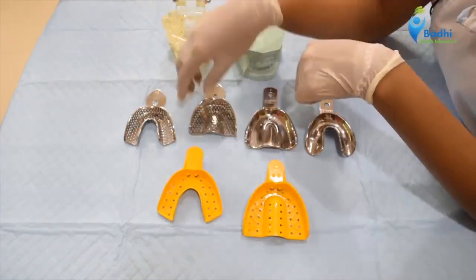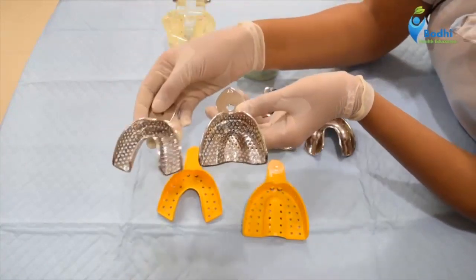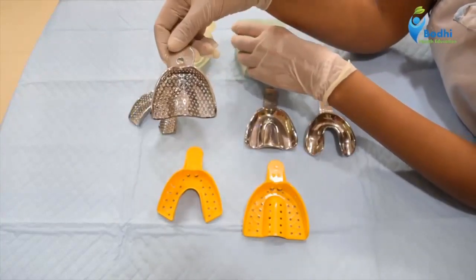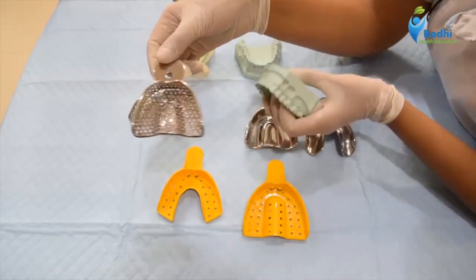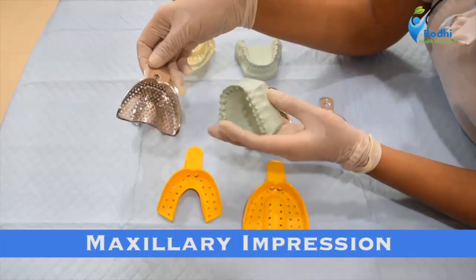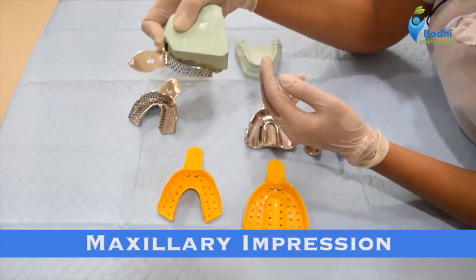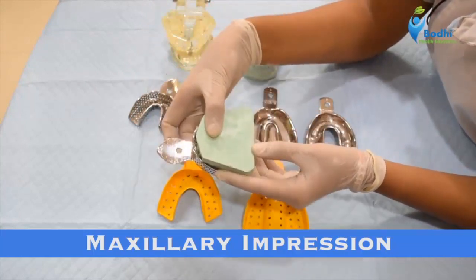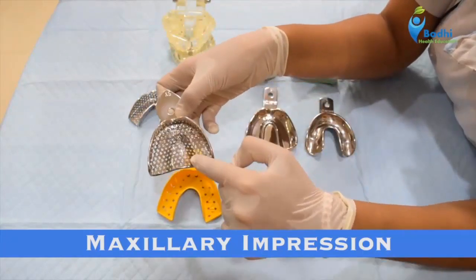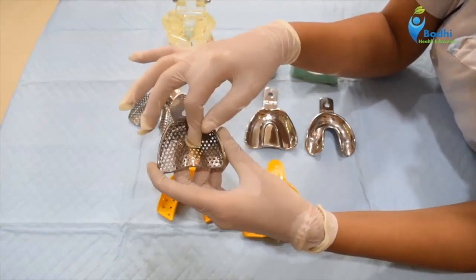Now as you can see, impression trays for the upper teeth and the lower teeth are different. So let us see what is the difference between the upper or maxillary impression tray and the lower or mandibular impression tray. This is a maxillary model. To make the impression of the upper or maxillary teeth, we use the maxillary impression tray. The maxillary impression tray has got a palatal vault. This vault area is used to record the palate which is present in the maxilla.